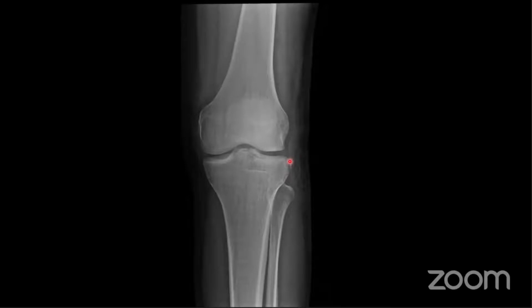Right, so let's see what you guys have said. So check foot drop. Oh, so you're talking about peroneal nerve injury. Yeah, good point. Yep. Lateral collateral ligament. Yes. So there are two things I want to illustrate with this. So I agree, there is an avulsion fracture of the lateral aspect of the tibia, and this is something called a Segond fracture, S-E-G-O-N-D, and it's a very common X-ray we see in radiology exams.